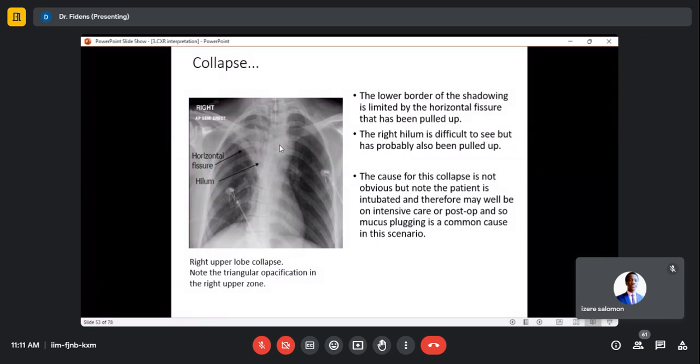Can you get the way I'm approaching this, the way we can not call it pneumonia, not call it a consolidation, but call it a collapse? No. Yes. I am trying to analyze and say, okay, I can see an opacity. Okay, I can see air bronchograms. So far at that level, calling it consolidation is not a sin.